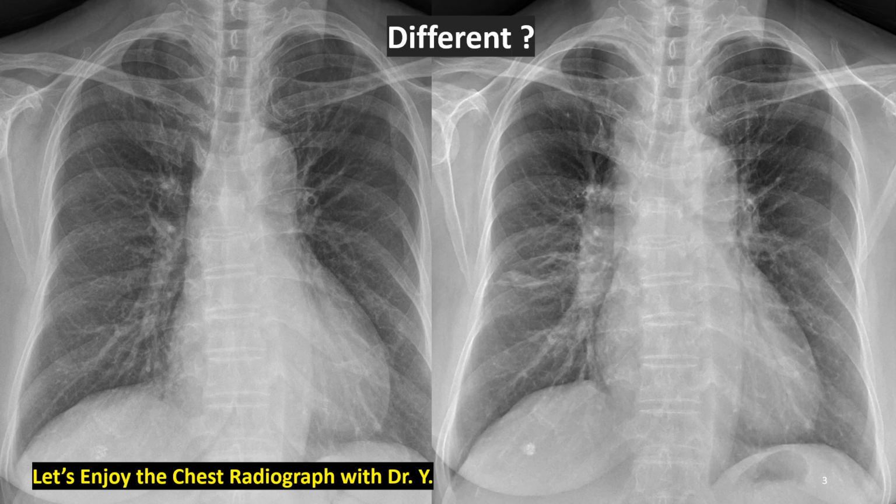This is her film today. What's the difference? Slowly find out and describe yourself. What's different between last year's normal radiograph and today's abnormal radiograph of the right hilum? Slowly describe, please. What do you find?